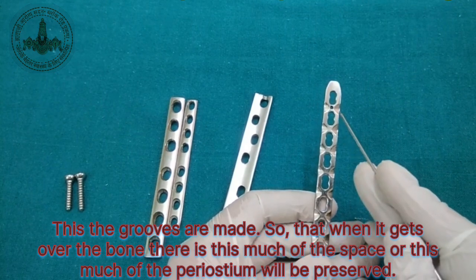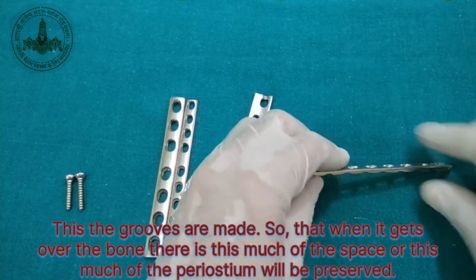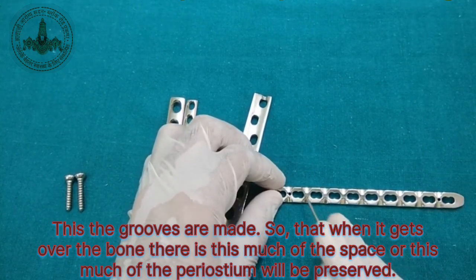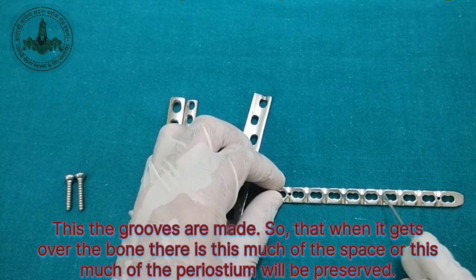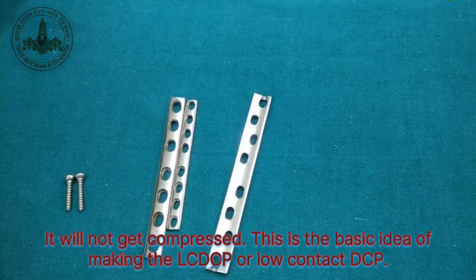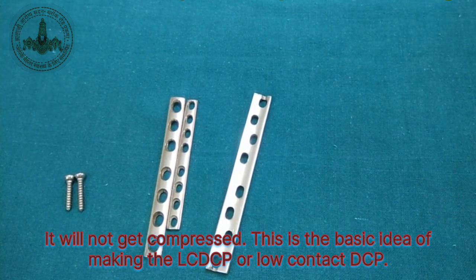इस तरह के grooves बना दिए, so that when it gets over the bone, this much of the space or this much of the periosteum will be preserved. It will not get compressed. This is the basic idea of making the LC-DCP, or low contact DCP.